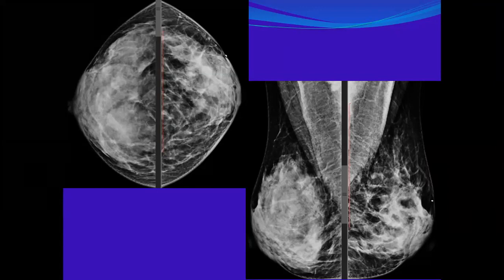Or maybe 2 if there is nothing. And for screening, to be seen in the next screening, if it is screening. But if it is diagnostic, then I will look for any clinical abnormality.